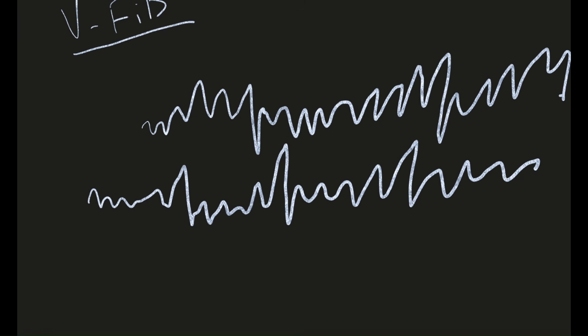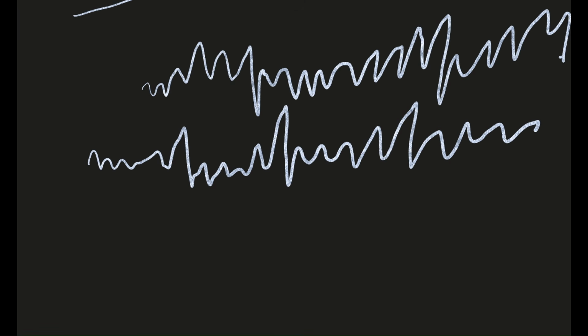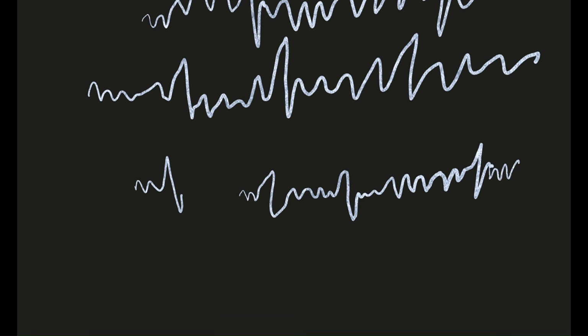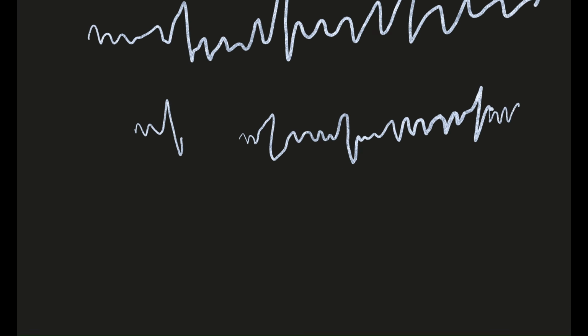There will be no specific pattern. There will be no typical sawtooth, but you can say it will be a variable sawtooth appearance. QRS complexes will be varying, sometimes small, sometimes big, sometimes smaller amplitude, sometimes stronger, wider amplitude. There is no definitive pattern.